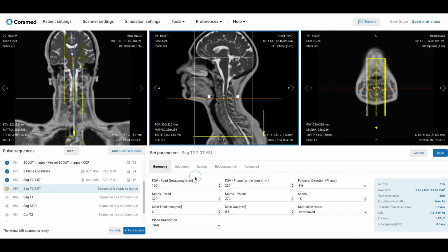First, since we haven't reduced proportionally in both directions, we have a rectangular shape. Such a rectangular field of view is commonly used in cervical spine since it reflects the spine's structure and can cover from the pons all the way down to T1 and T2 vertebrae. Most importantly, we're keeping that voxel size at a lower value. We can even adjust the matrix size in the frequency direction slightly lower and still keep a lower voxel size or increased resolution for this particular sequence. Now at 3 Tesla, we have another important characteristic, which is the boost or increase of flow artifacts.